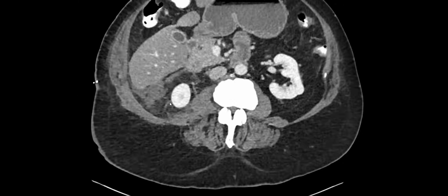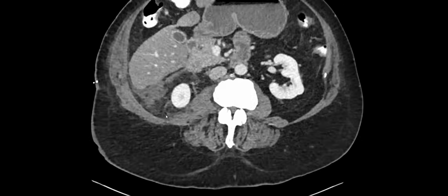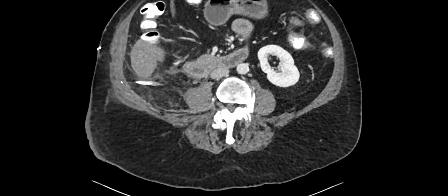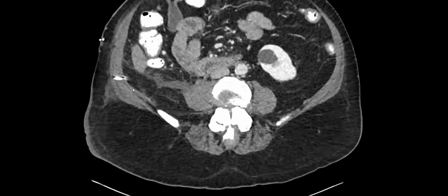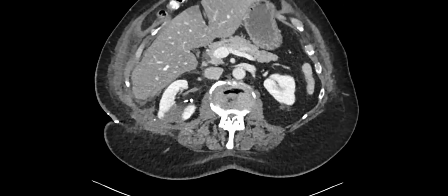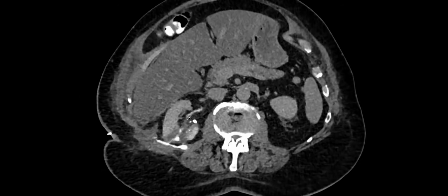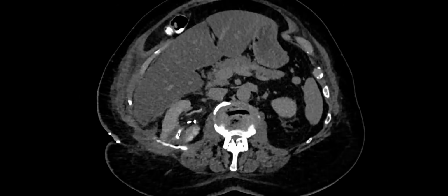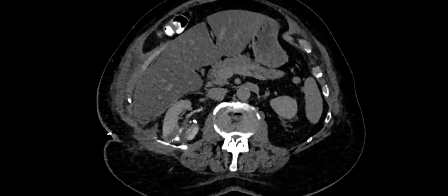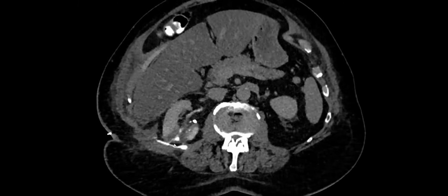Even though I thought this amount of fluid is kind of normal, not unexpected, maybe just some blood products, the urologists were like, actually, there's a lot pouring out of this drain and the creatinine is elevated from the drain fluid. So we had a high suspicion that maybe there's a urine leak. Luckily, we protocoled this as a urogram, so we do have a delayed phase. And here is the delayed phase, where we can see on the excretory phase that the excretion from this calyx is going directly out of the partial nephrectomy site into the perinephric space. So there's a definite leak.